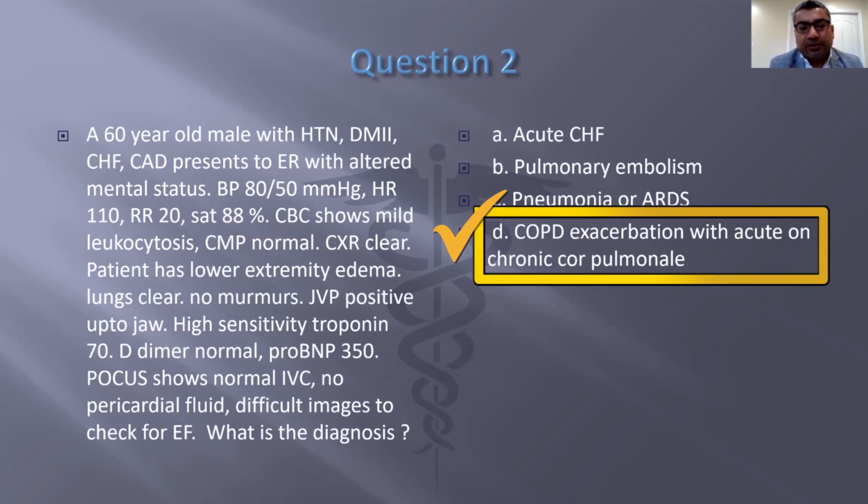Now, why would I choose the last one, COPD? Because if you see the lungs are clear, legs are swollen, and JVD is high, so they have acute and chronic cor pulmonale. Most of the severe COPD patients come with a lot of leg swelling, and they have cor pulmonale. So if you try to do other things such as acute PE, other things start happening.